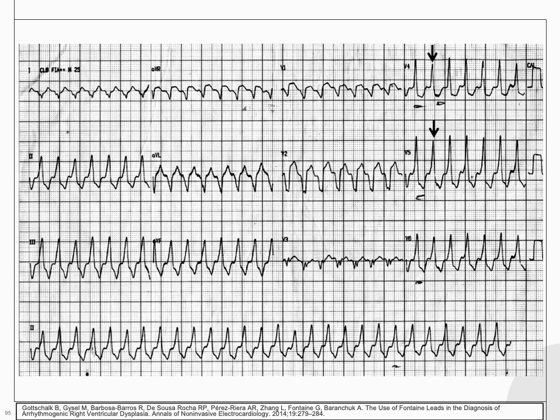Here we have a wide complex tachycardia. In fact, this is ventricular tachycardia from a 68-year-old man presenting with syncope. What might be causing this?